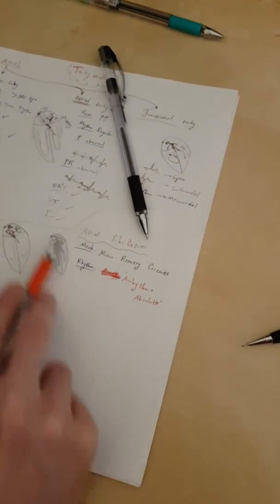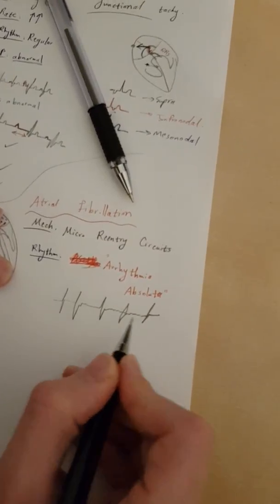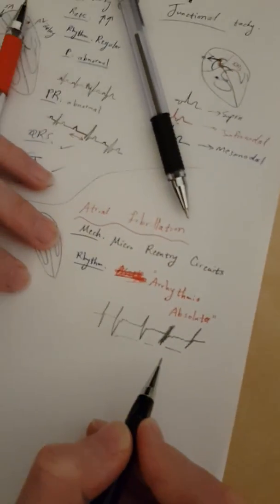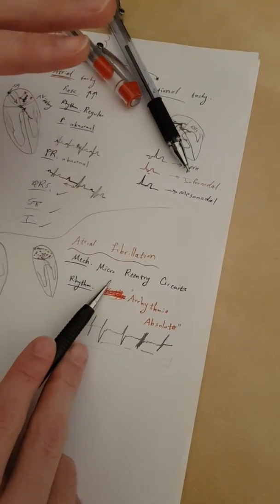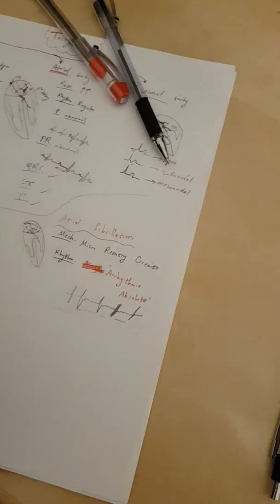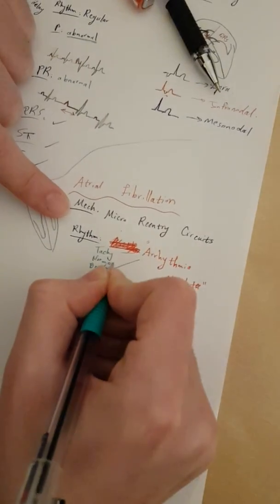It means that in atrial fibrillation, this arrhythmia absoluta is not just irregular. Okay, sorry about this. It doesn't mean only that the distances are not the same, but also that if you add them all together within 1 minute, they might be less than 60 or they might be more than 100. There's no rule. So it can be tachyarrhythmia absoluta or normal arrhythmia absoluta or bradyarrhythmia absoluta. So the rate is not a rule here. This can come with tachy or normal or brady.